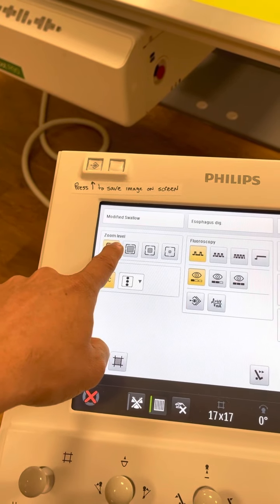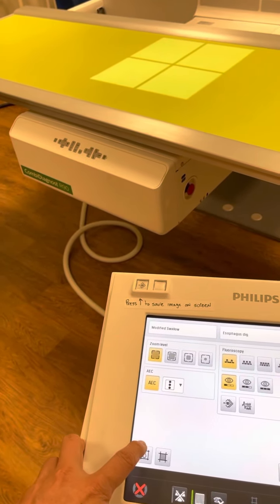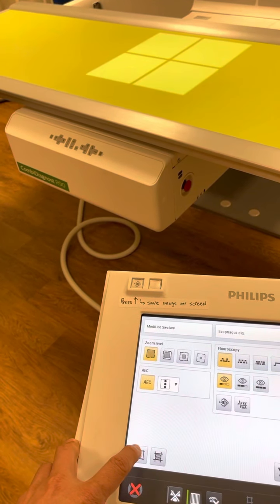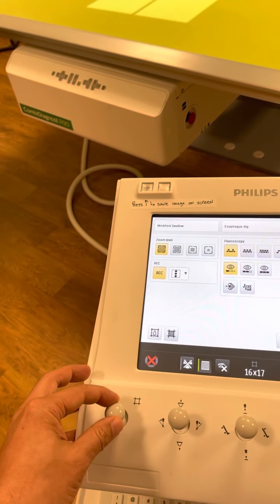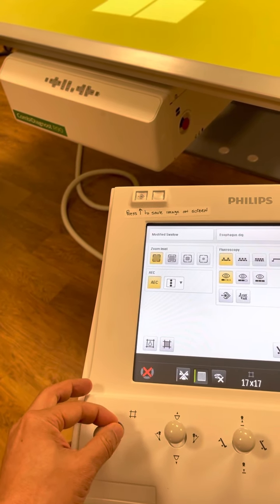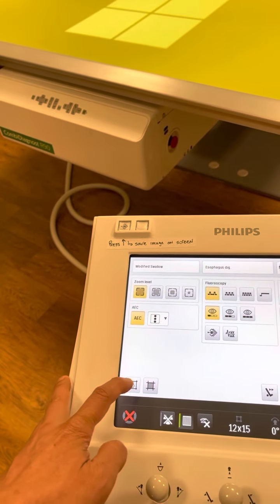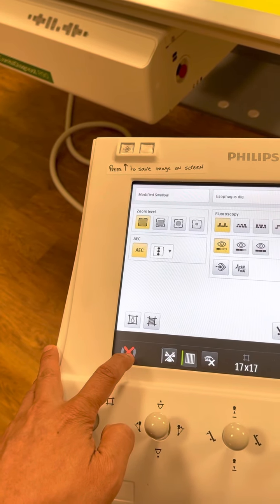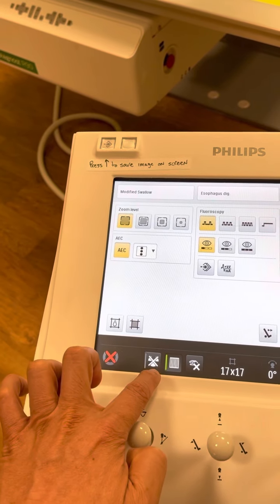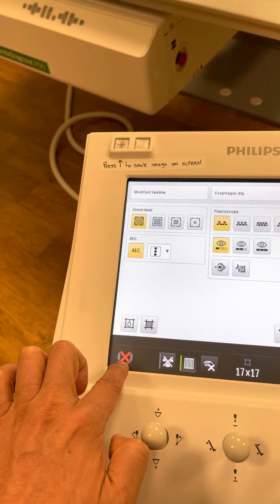Zoom level is very easy to understand from the picture, and this one shows the light for the current X-ray coverage area. You can collimate small, yeah, this is easy to control, and to take that out, just cancel that button out. This shows no X-ray, then the technologist has to activate it for us. This one shows no X-ray, and this one is not active.